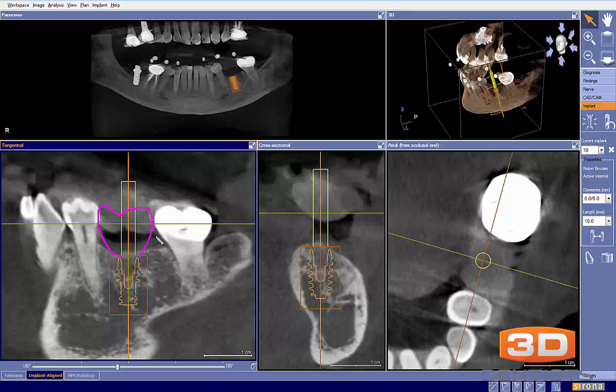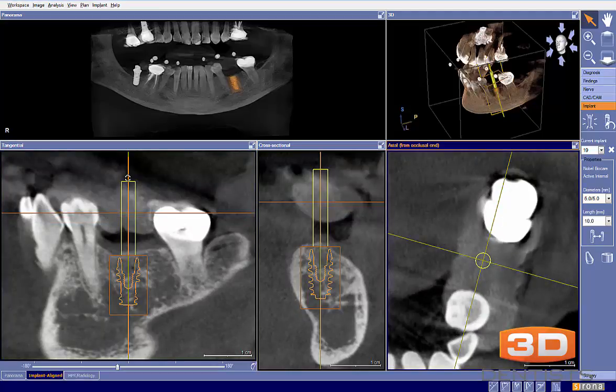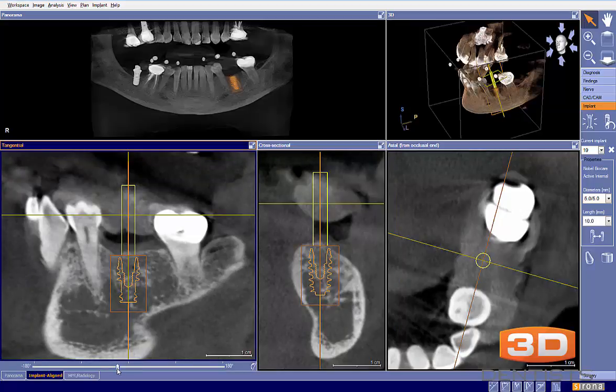we can see that I'm going to have pretty even spacing roughly, and once you have the CEREC data in there, that'll be a little bit better. So something along this line right here. There we go. From a perspective, I know that roughly this implant can be done. There's plenty of bone there. Stability is going to be a relative non-issue here. I do know that we have a medullary cavity right in this area, so that part of the implant may not be in full contact with the bone, but I don't see any major issues here.